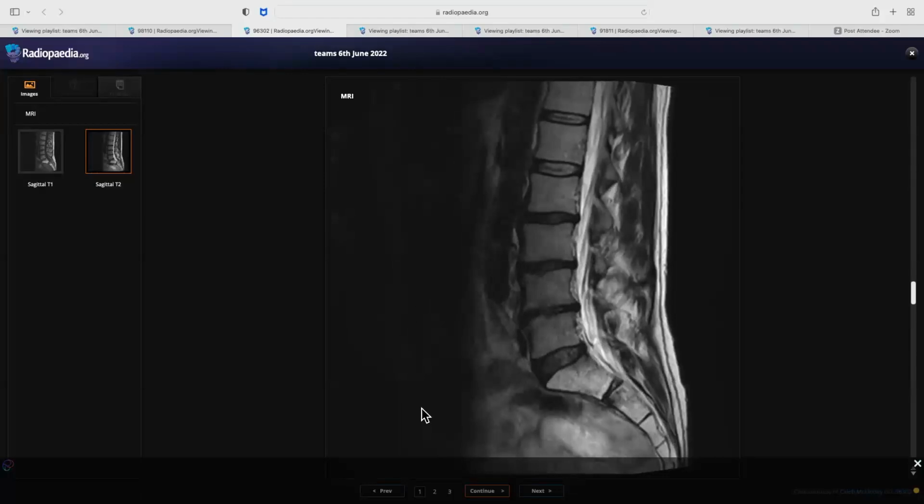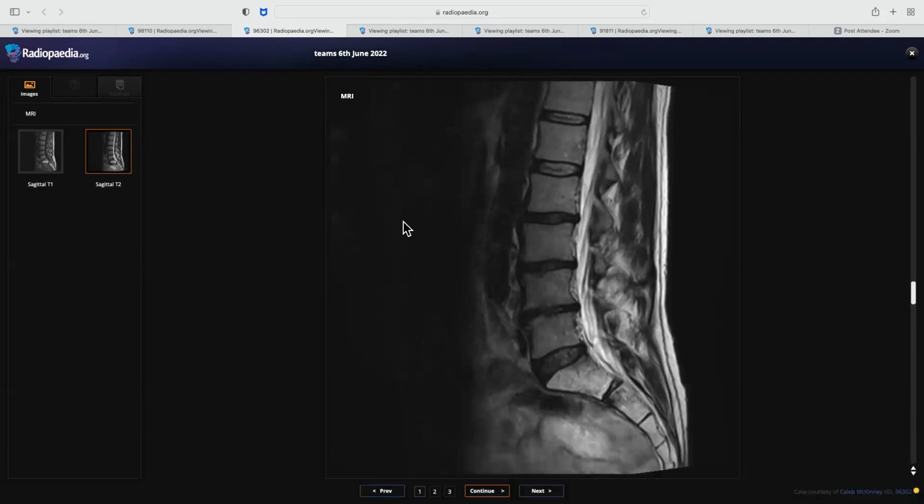So now I'm more focused on the pelvis to look for some malignancy sitting there or some abnormality which may cause this appearance. And I would also assess this in coronal view. Yeah, the patient underwent radiotherapy for rectal carcinoma.